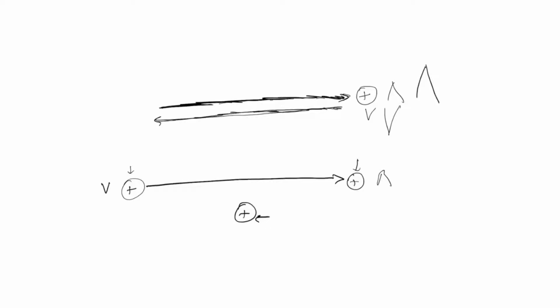Notice how the flow is pretty much perpendicular to the third lead. So initially, it seems like it's approaching the lead, and so you would have a positive deflection. When it's right in the middle, it returns to the baseline. And then when it recedes from the lead, you would see a negative deflection. And once the flow is complete, it would return back to baseline. So in essence, you're seeing a biphasic pattern.